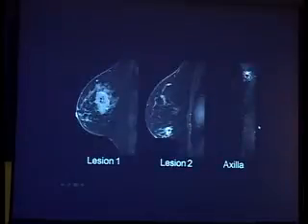Going back to the diffusion. Lesion 1, lesion 2. They're bright. Is that malignant or benign? Or I just don't know. They're malignant, right? And this is meant to be a malignant case, you know, the mammogram, the ultrasound, the MRI, everything together. And this is just a classic cancer, something you read about in the textbooks, okay, not so difficult.